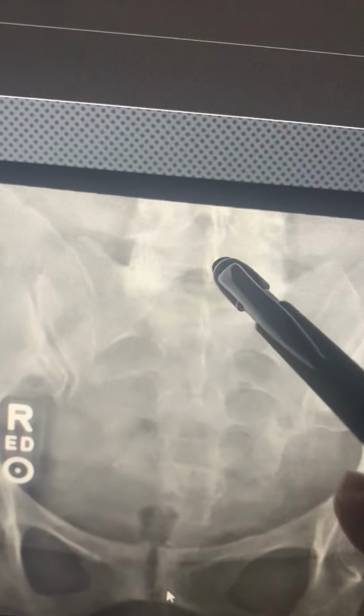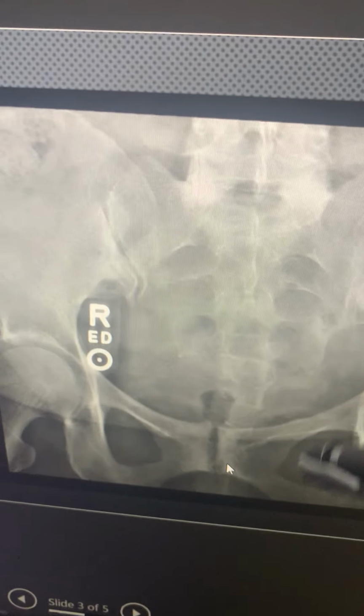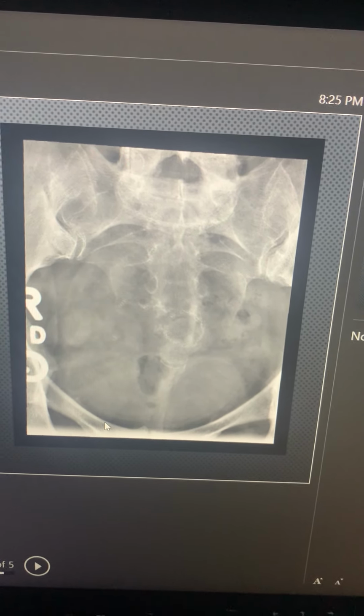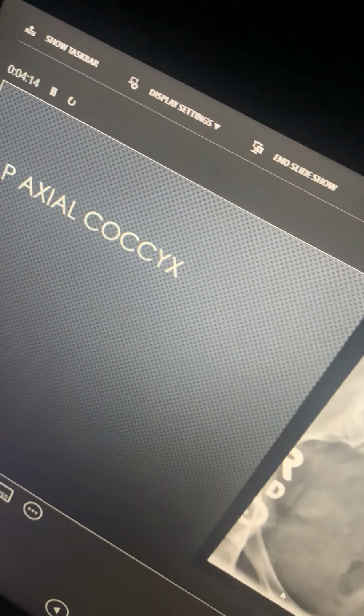Because we can see so much detail, it has great contrast and enough density to make out some fine bony margins. As you can see, there was a fair amount of cloudiness there, and you can see little bubbles here and cloudiness here. It's safe to say that that is all stool. Moving on. No immobilizations were needed for this imaging, and the patient was just supine. She wasn't shaking. She wasn't causing any distortion with a blur.